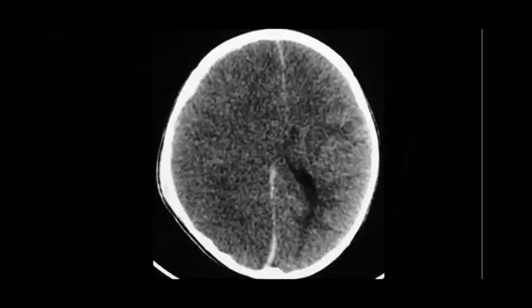What happened here in this pediatric patient? Could be ischemic. Yes, maybe ischemic injury. How do you describe it? Can you see any characterization in the right cerebral hemisphere?